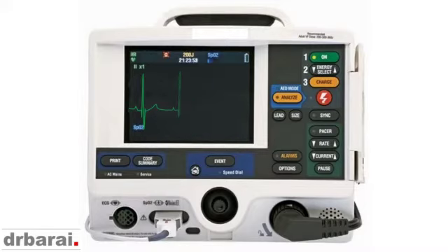So this is another young patient coming with palpitation, and we put the patient to the resuscitation cubicle, connected to the defibrillator machine, and found this. If you carefully look at it, here the QRS complex is a little wide and the P wave is very close to the QRS complex. The PR interval is very short, which can be well demonstrated if we do a 12-lead ECG, but also there is a little delta wave which is just in front of the QRS complex.